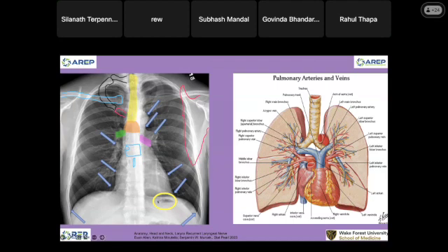Is it the superior vena cava here, I think? The space between the stomach, which has air in it, and the diaphragm should be less than 1 centimeter. If that is thicker than 1 centimeter, we are talking about a structure called the subpulmonary effusion.